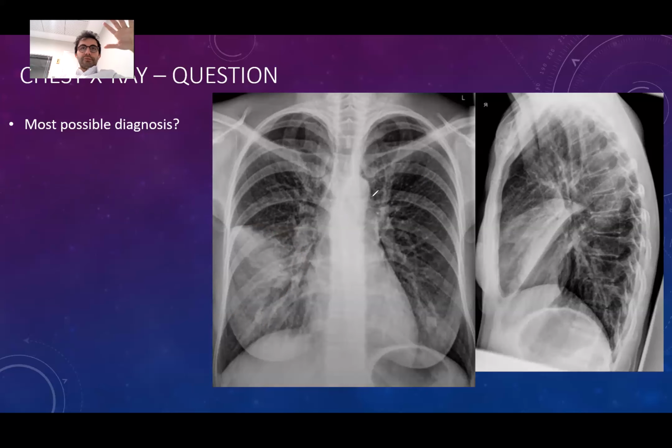Very well, yes, because it can come with consolidation as well. So you have to look at the clinical picture. We are also seeing the oblique fissure on the lateral graph and the horizontal fissure on the top. So this is consolidation on the right middle lobe, mostly consistent with pneumonia.